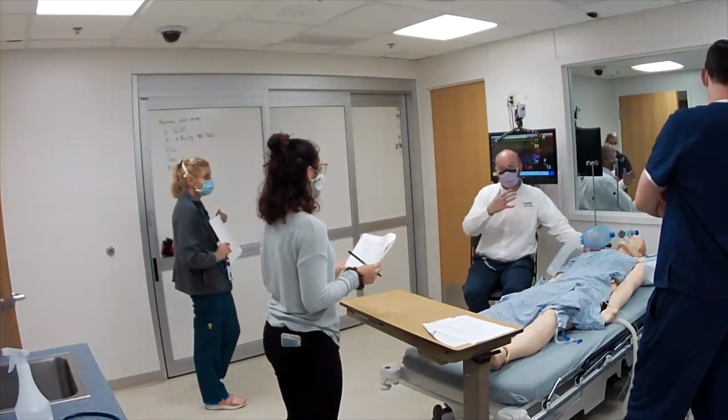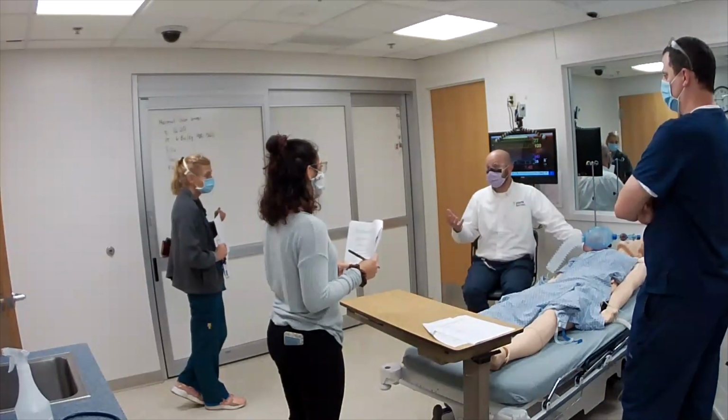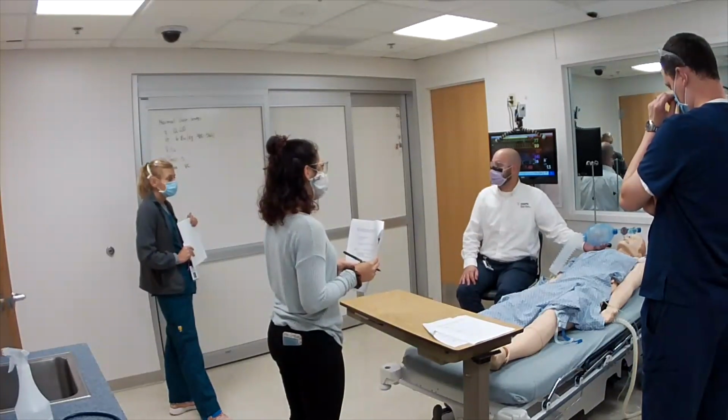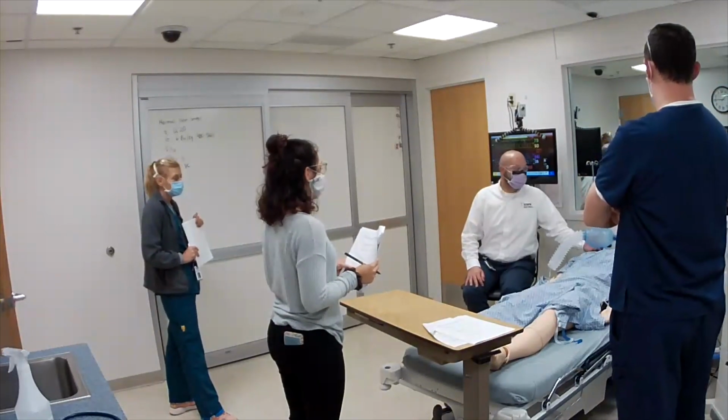Because if the patient triggers a breath, and they should be able to trigger a breath, they're getting the whole thing. They're not going to get a little baby breath. And most of us don't breathe 560, 12 times a minute. That's just not how most of us breathe, right? But there are some advantages to volume control. So let's contrast that with the next one on there.